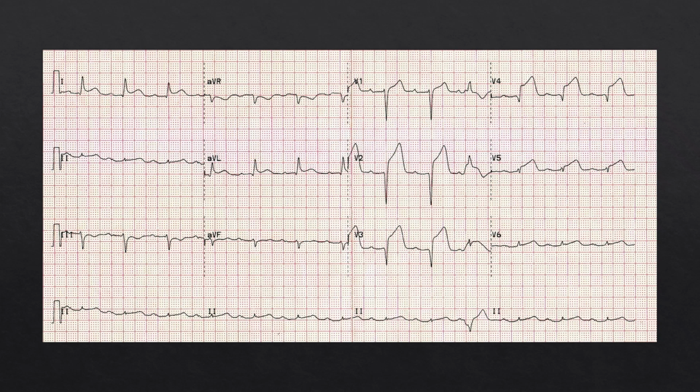And here's just another example. We have ST elevation in leads V2, V3, V4, and V5. We have an ectopic beat, which is also showing concerning signs for STEMI. We have the straightened ST shapes, hyperacute T waves. We have obvious Q waves as well, extending out. And then in V5, this is a good example of what I was talking about, where your QRS complexes can shrink in size and become dominated by that T wave.